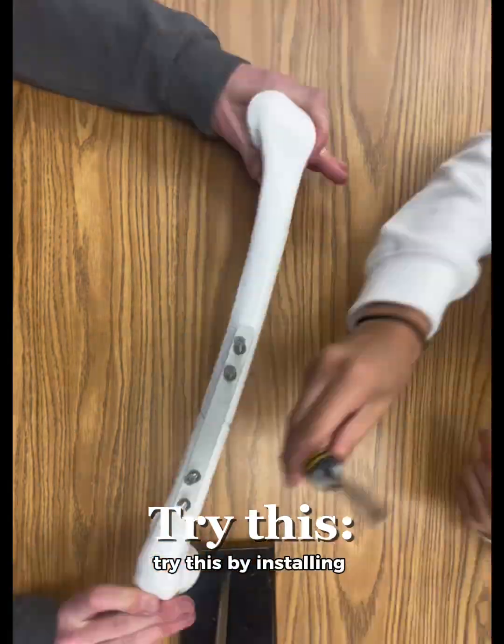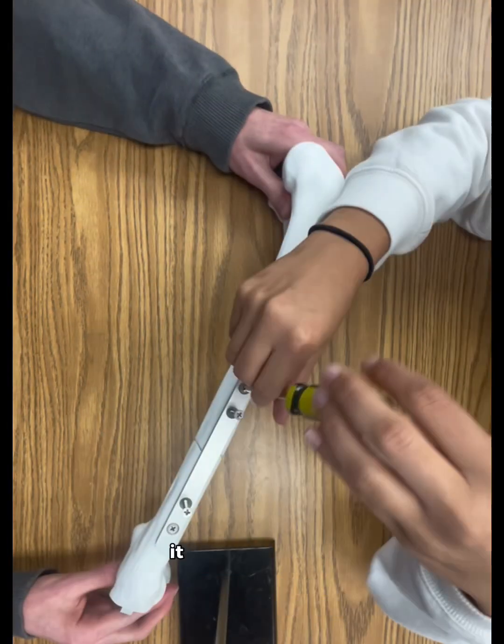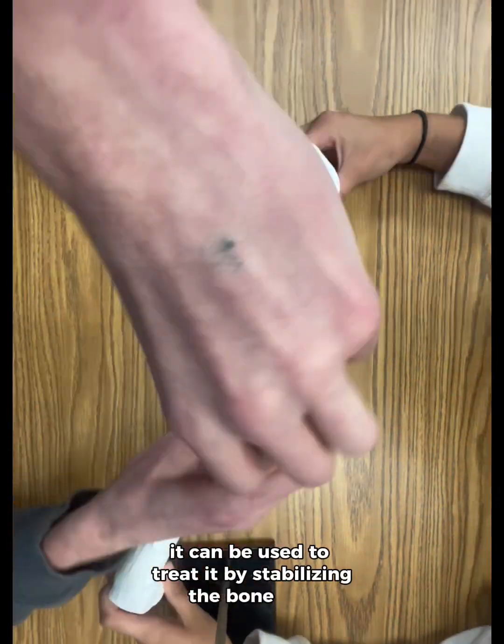Try this. By installing a bone plate on a transverse fracture, it can be used to treat it by stabilizing the bone and helping it heal.